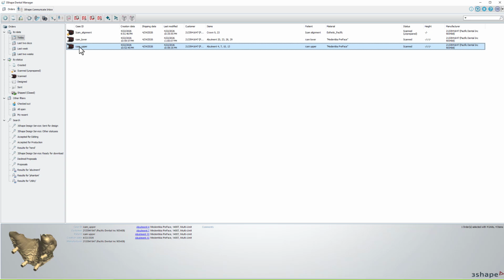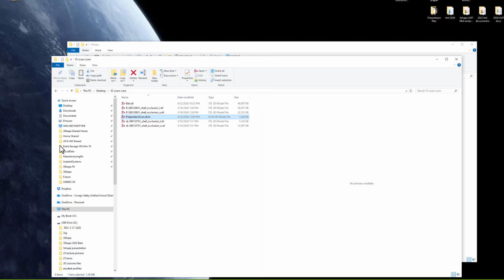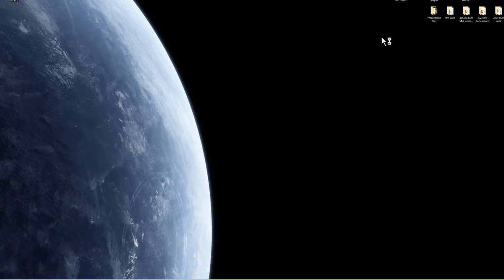So when we come here, we are now going to go to that case that we created. Of course. Sorry, guys. Let me launch it back up.